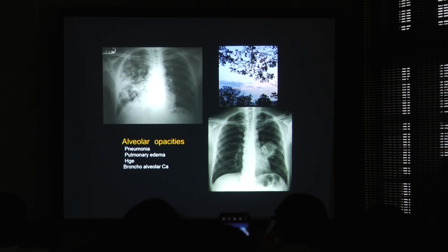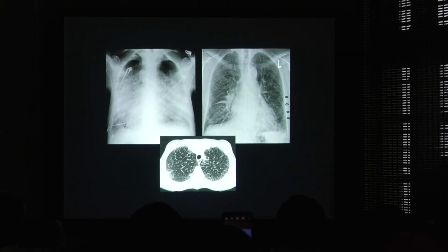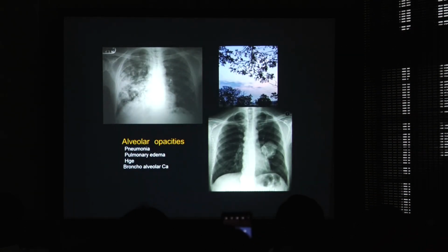Okay. So here, in this case, you look at this is a mass lesion. I think you have no doubt. Now look at these lesions.